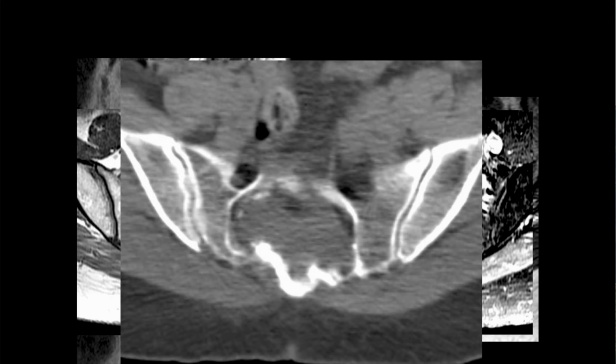So if you go to CT scan, this is what it looks like. So what do you think this is? I'm not sure exactly what this would be. Okay, so this is another arachnoid cyst. And these are probably congenital. They can expand the neural canal here. If they expand like this, they may be symptomatic, but that's a little bit controversial. You can usually see the nerve roots going through these, maybe, or displaced around them. And I think most of these are not symptomatic. This is a prominent one.